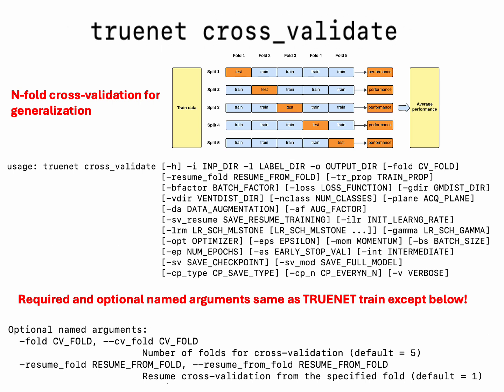Right, and we also have an option called resume fold, which is very similar to the save and resume option you have, whereas in a very resource constrained environment, if you want to save and resume from where you left, you can do so. Here you can save the fold if you have already performed 3 folds and if your job has ended in the queue.